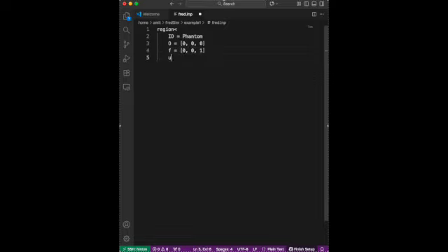I have the forward vector, now I have the up vector, and I say that the y direction is my up vector. The reason to define this vector is to make sure, when we rotate the beam later in the simulation, when the simulation gets complex and we are defining beamlets and the geometry is quite complex, that we take care of how we are rotating the proton beam.